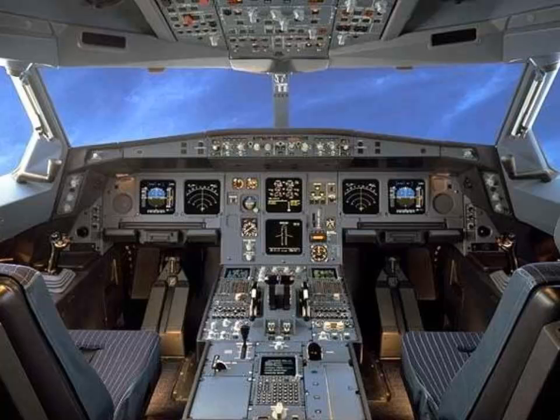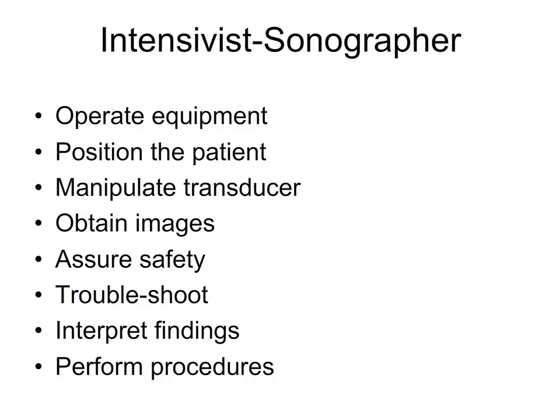I cannot stress the importance of understanding what all the knobs and dials do because as the Intensivist-Sonographer, you have to 1. Operate the equipment, 2. Position the patient who is uncooperative, or at best, unresponsive, being careful not to dislodge any critical lines or tubes, 3. Manipulate the transducer to obtain necessary images while all the time assuring safety of the patient, troubleshooting technical failures, and interpreting the images you obtain. Oh, and yes, you will be expected to do this all with one hand, because your other hand is holding a needle getting ready to perform a procedure guided by your ultrasound images.